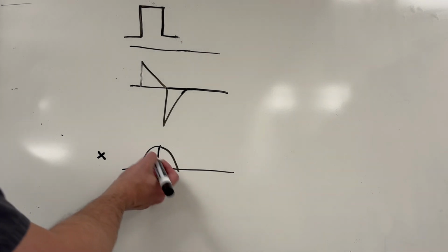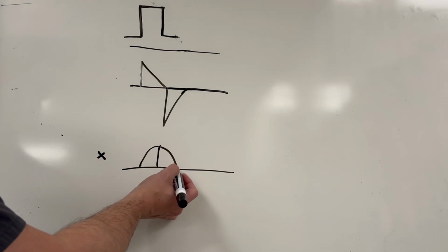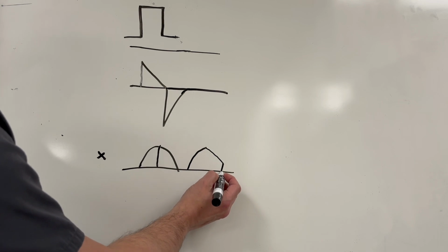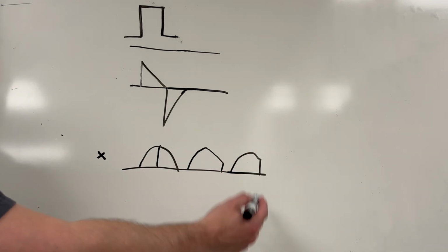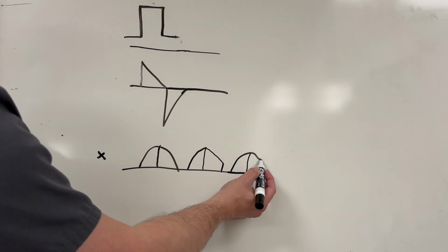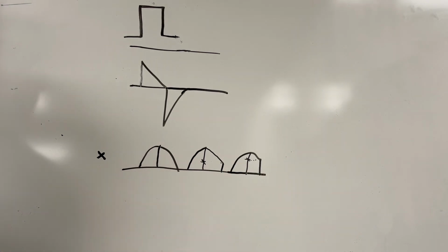The visual representation of having a leak is that the exhaled tidal volume coming back from the patient is going to be less than what was pushed to the patient. So when we push in our inspiratory volume, as we're coming back, it won't reach its baseline. The bigger the leak, the sooner it will drop straight down. So this picture has a bigger leak than this picture. If you look at where it meets that middle line, this would be a 70% leak and this would be like a 35% leak, just visually looking at it. The sooner it drops, the bigger the leak.